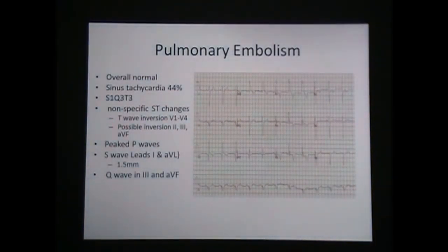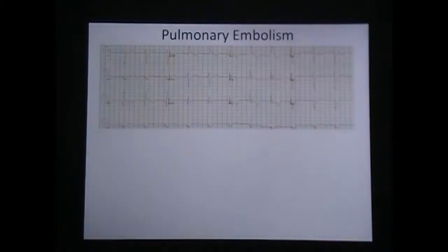Okay? Right there, you see that in EKG, and they've had those risk factors that we talked about, the immobilization, long travel, obstetrics, all those kind of things. Your index of suspicion should go up for pulmonary embolism. They can also have right bundle branch block. Okay, remember we look in V1 for that. So here I kind of enlarged it so we can look at it.